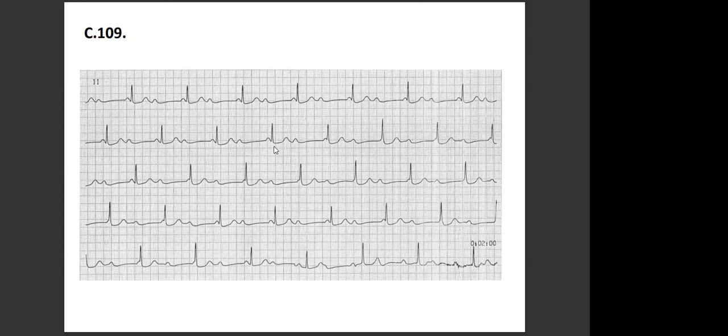So you can ask the patient, for example, to move a little bit or step up and down, and afterwards look at the ECG again, or take a deep breath, for example, because that will slow down the sinus activity. Again, you can see that the PR will change. Okay, good. Nothing else.